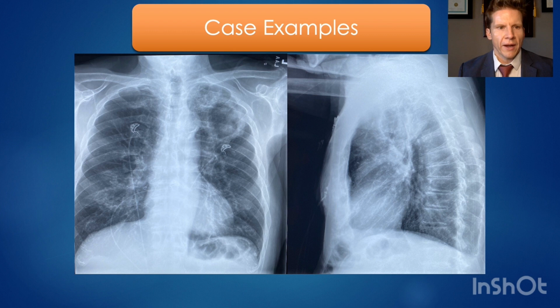Okay, so for our final example here, we've got a PA and lateral radiograph.